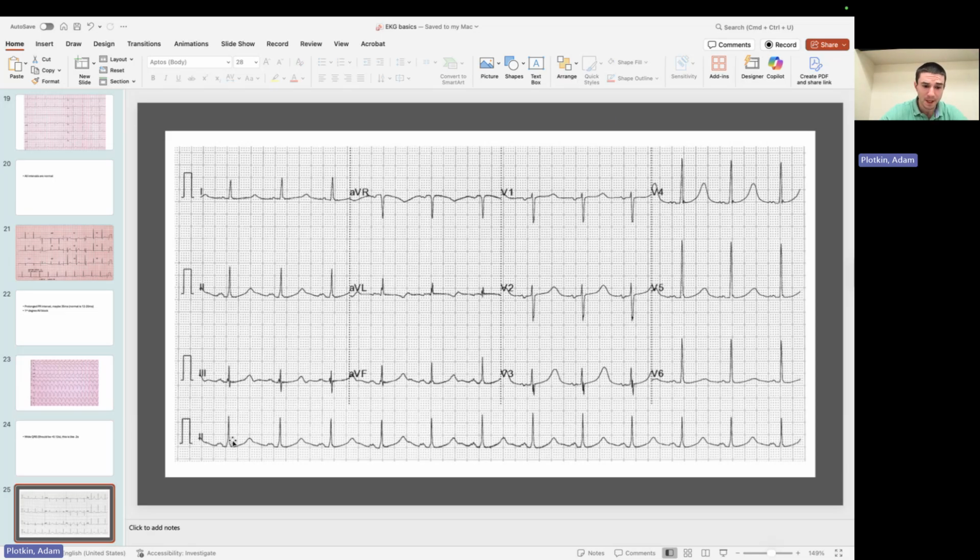And then you see here, here's the P, right? Definitely within 3 to 5 little boxes. The QRSs all look nice and narrow, but there's something going on with this T wave, right? If you see where the Q starts and where the T ends, it doesn't get back to baseline until all the way over here, right? That's way further than 1/2 the RR interval. So a lot of students get it wrong. Again, we could even use this one. It's not this little divot here. It's where the T wave gets back to baseline. And it really does not get back to baseline until somewhere in here. So that's definitely a prolonged QT interval, right?